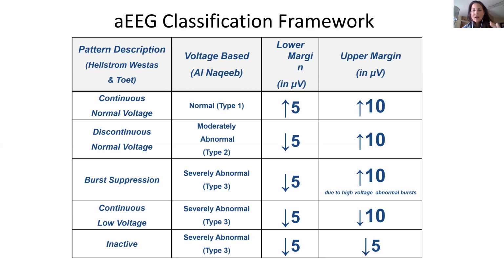So if it's between that 0 to 3 kind of area, that's that low discontinuous. And then from that 3 to 5 being that high discontinuous. So you can almost rate the maturity over time as things start to move their way up towards that 5.